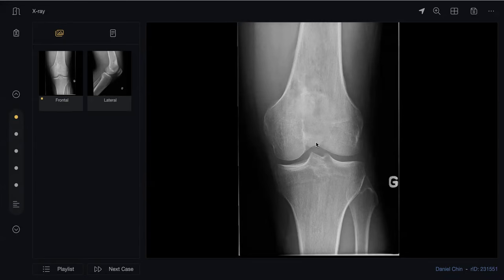I will put osteosarcoma as the principal diagnosis. Ewing sarcoma is the differential diagnosis. Osteomyelitis also. I will ask about the clinical history of the patient and request an MRI of the whole femur, and refer the patient to a sarcoma center for biopsy and CT for staging.